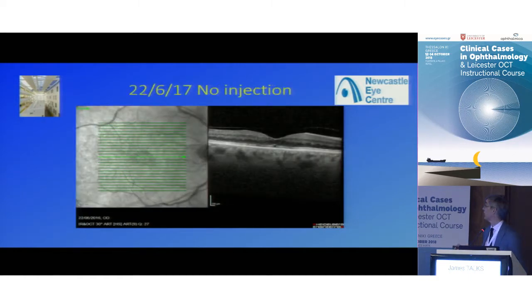There's possibly a little bit of a defect here. We're holding off. We're doing PRN as our regime of injections. We're not treating till fluid comes back. So one of the questions is, is that a good plan?